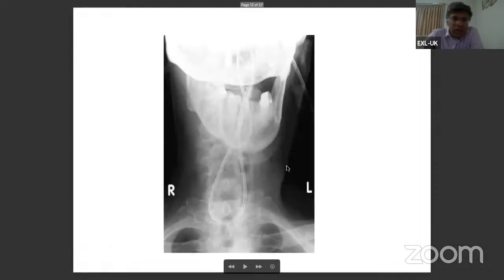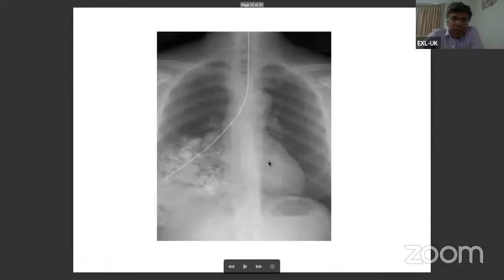Next slide, please. And you can also have situations like this in which there's a problem with the airways. There is a problem with the positioning of the patient. The nasogastric tube is coiling around and around and going up to the skull. Again, next slide, please. And when you get it wrong, this is what happens. You get food, all the rice and curry and everything onto the lung, and that's chemical pneumonitis and consolidation. So this is not what you want to happen.